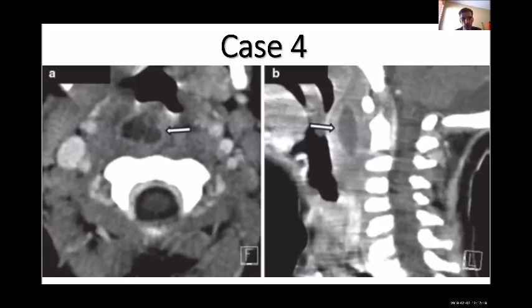Unmute yourself and answer. Retropharyngeal abscess? I think yes. Or parapharyngeal, somebody said parapharyngeal. Both are correct, I think, retro, para. Although para is from the side, not anterior, but yes, it's an abscess.